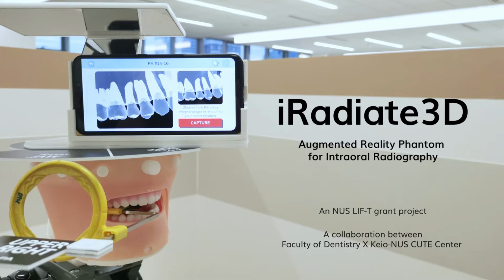Hi, welcome to the app for iRadiate3D. You will be using this app along with the Phantom to practice positioning for intraoral radiograph.